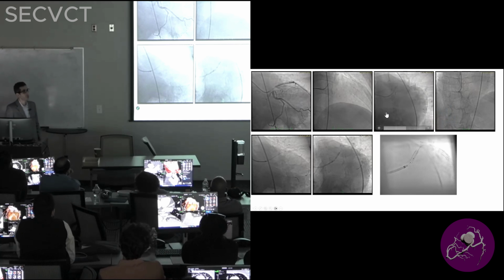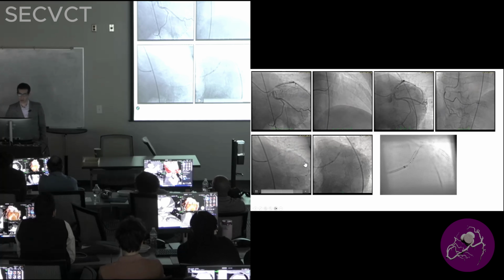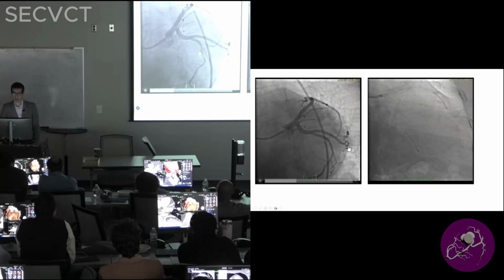And clearly what we saw before, and we asked them actually for IVUS. So they confirmed on the IVUS that the lesion was 3.1. Was amazing correlation, and the proximal segment to the lesion was ostium, so they could not go, and they went distal to it, and they went up to 13, 14 millimeter. So they called it severe, and you can see they intervened on the LAD, and that's the final result.